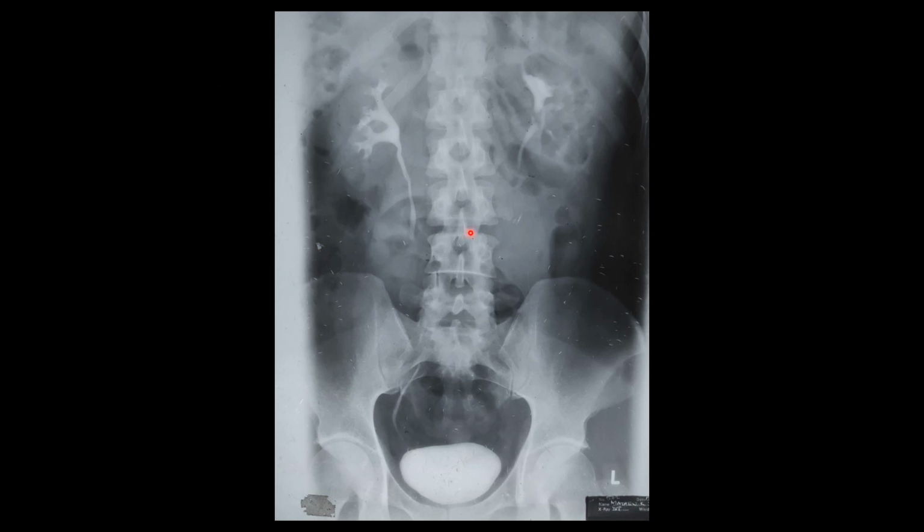The structures that are visualized over here will be the outline of the kidney, somewhat visualized over here, and on this side you can see the minor calyces. They are joining to form the major calyces. You can see one or two major calyces over here. They are joining to form the dilated renal pelvis, and as the continuation of the renal pelvis, you can see the ureter. As clearly shown in this diagram, the ureters pass along the tip of the transverse process of lumbar vertebrae. Finally, they reach the urinary bladder, which is visible as a radio-opaque shadow within the pelvic cavity.